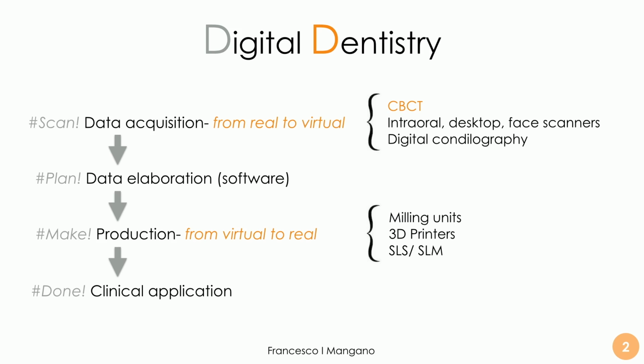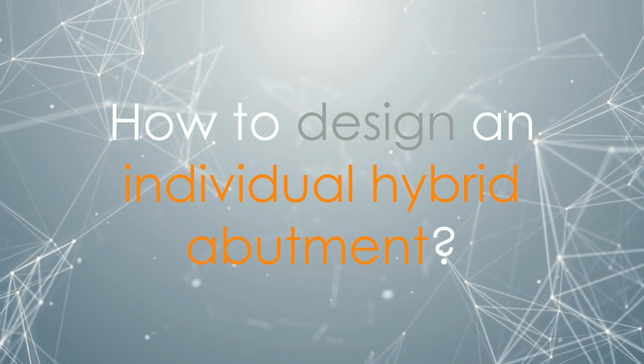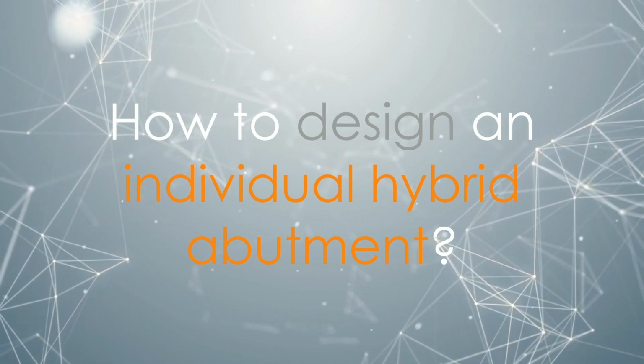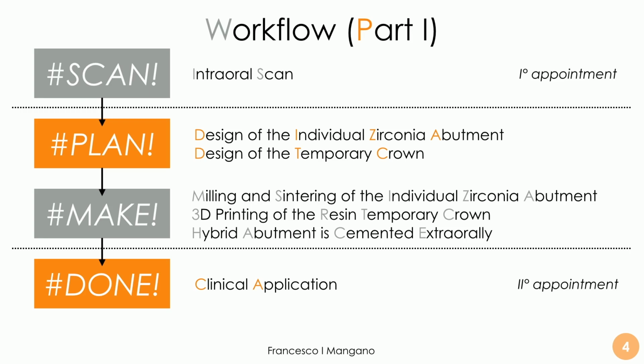When we have all this set of files and all these pieces ready, we can go for the clinical application. So let's talk a little bit about this workflow for the individual hybrid abutment. In a very simple case, I will show how to design it. It's something more related to the dental technician world, but it is also something we need to consider as dentists as an option for our treatment, even in the posterior sites, because it's more beautiful, more functional, and absolutely feasible in all cases.